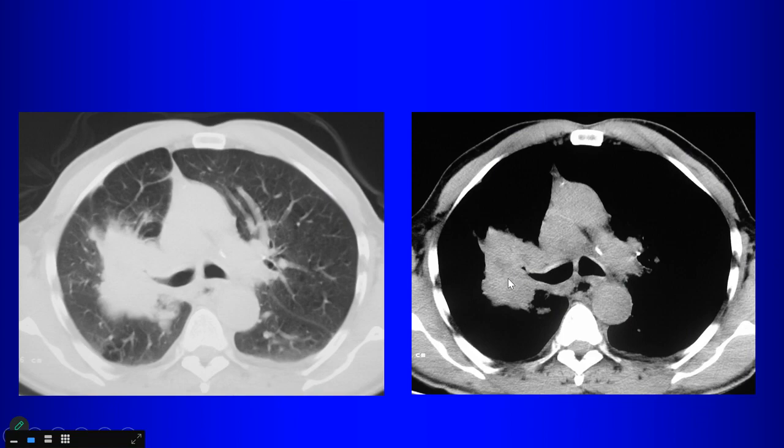What do we think this tumor was? Well, if it's large like that, it's probably going to be like a small cell. Well, small cell is usually more aggressive and tends to be associated with extensive lymphadenopathy. This lesion is presenting with atelectasis, and it's involving the right upper lobe bronchus. So central lesion presenting with atelectasis, we're going to think about what? Endobronchial. So what lesion does that? What cell type? Squamous. Squamous cell, yeah. So this was a squamous cell cancer. So squamous cell cancers can present with obstruction, central lesions.